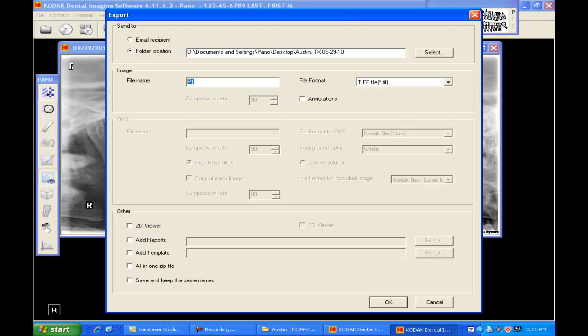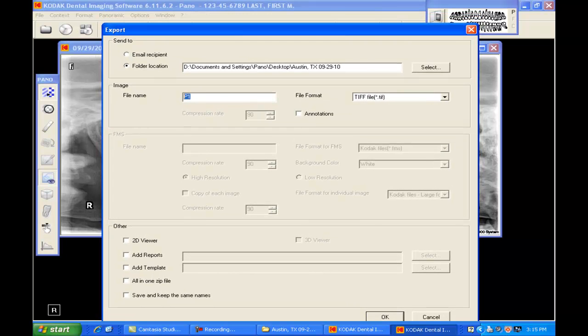This is very important. You must do it in the right format. If you look right up here, this is our patient information. You will type it pretty much the same way, but you will type in the social with the dashes.